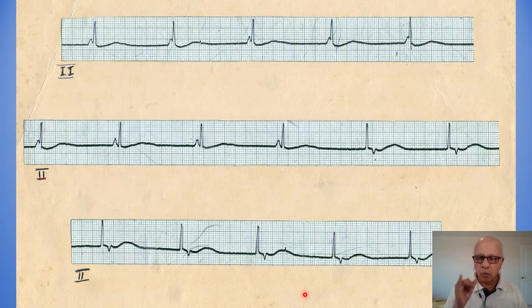So repeating, what is the arrhythmia? What is the cause of the arrhythmia? What investigation you would like? What most important, give me only one investigation. Important investigation you would like to do, both to confirm the diagnosis and plan your further action. And what treatment you will offer for the patient. So I'll give you about 3 minutes or a little more than that, because I know there are 4 questions to be answered.